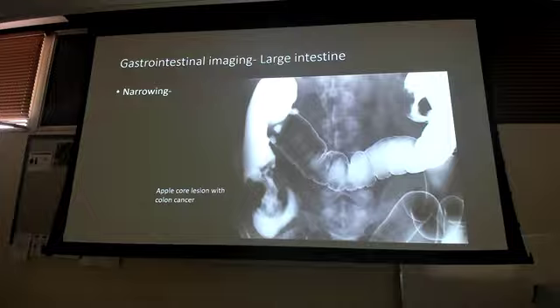But if I were to get this x-ray, guess where they're going next, guys? CT. I'm throwing them on the scanner because I want more details of how large this lesion is, where it's at, and what the heck is going on up here in the upper right-hand corner. They're eventually probably going to get a colonoscopy as well, right, to really look on the inside to see where is all of the cancer, how bad is it. But if I catch this on imaging, I'm getting a CT next because I want more information about that right upper quadrant area here of what the heck that is and why does it look like that.